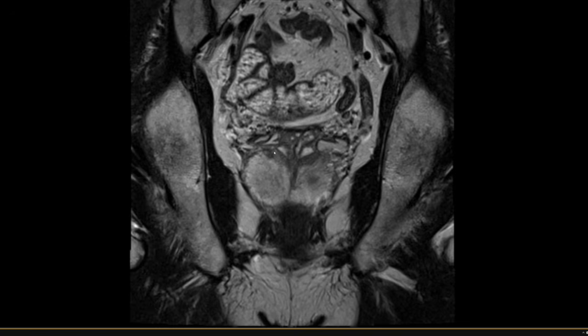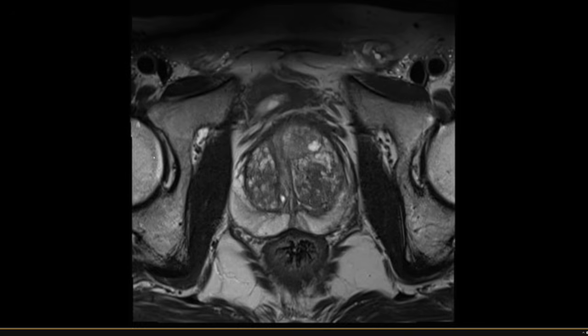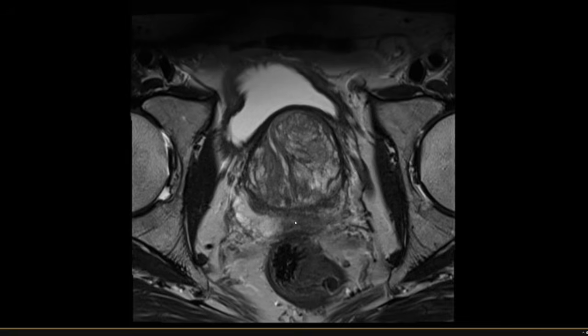When there are less BPH changes, it may come more inferiorly like this, but again, it should be pretty well defined and wedge-shaped rather than have any convex borders here as well. And so this is important to know because one could easily, at least on these T2 weighted images, think that there is something here in the PZ. But if you know your normal anatomy, you know that this is just compressed CZ or central zone.